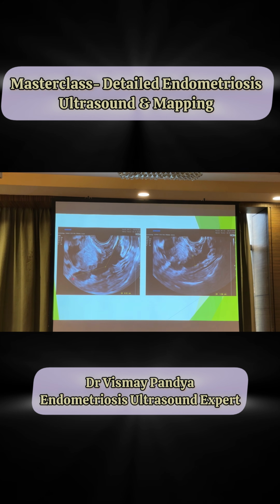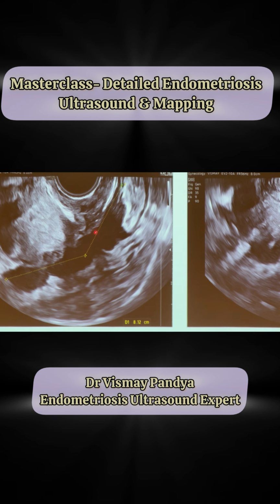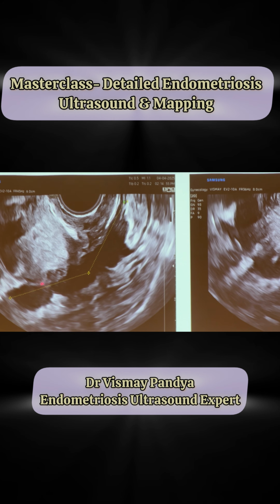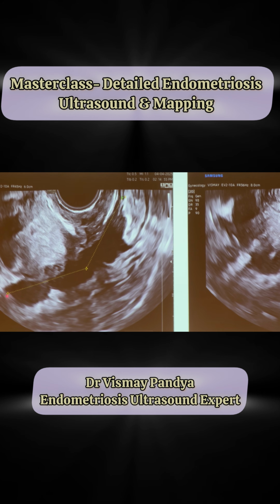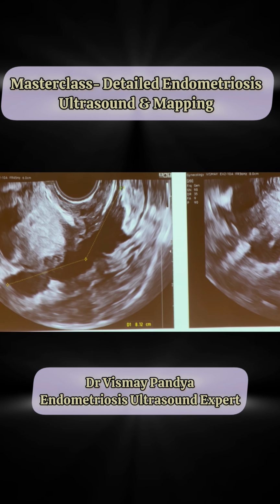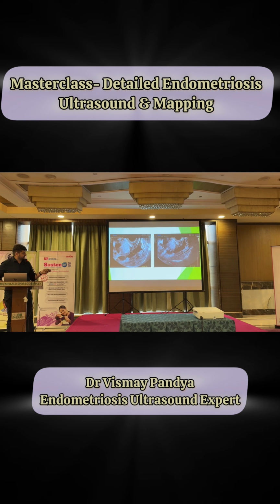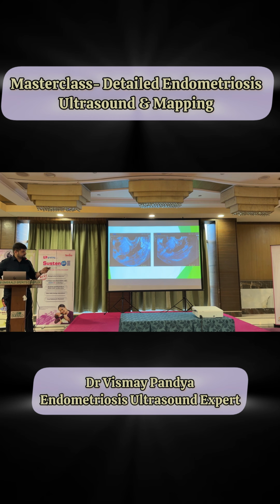So this case we had from Kolkata. You can see this whole black thing. It's the whole nodule. It's starting from the vagina, and you can see the fundus is ending. This is the uterus, and it is going till above the fundus. So it was covering the whole rectum, mid rectum, and the lower rectum. Around, you can see that distance is 8.1 centimeters. It definitely requires the whole 9 to 10 centimeters of bowel to be resected in this. You can see I have measured the depth.